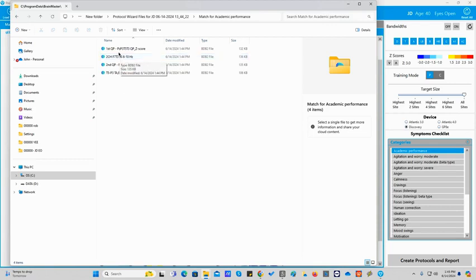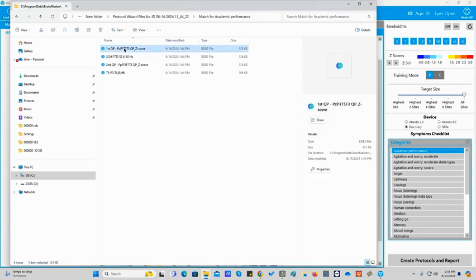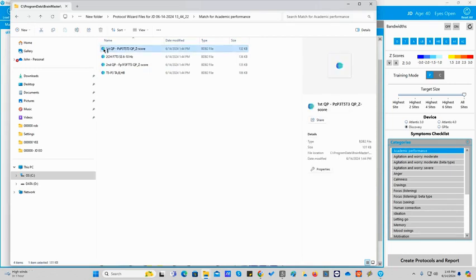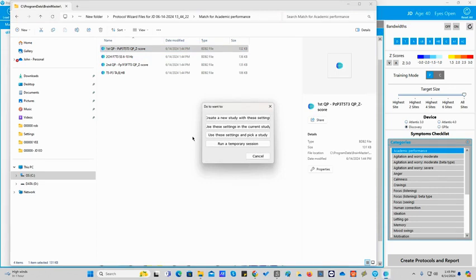So let's look at our first QEEG Pro training protocol. I'm going to copy this name. I prefer not to write it down on a piece of paper. I'm going to copy it. Click pause. When it's dark blue, right click, copy. And then I'm going to click in this area. And now I'm going to double click on the baby blue head. It will open up BrainAvatar automatically.